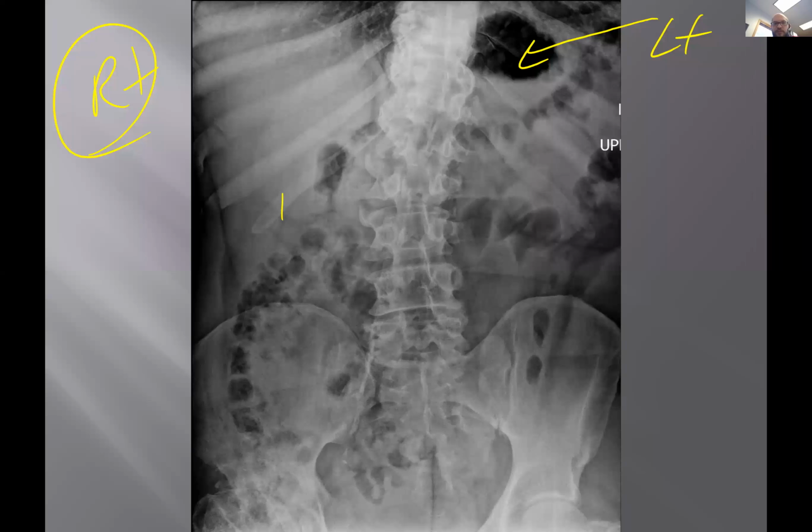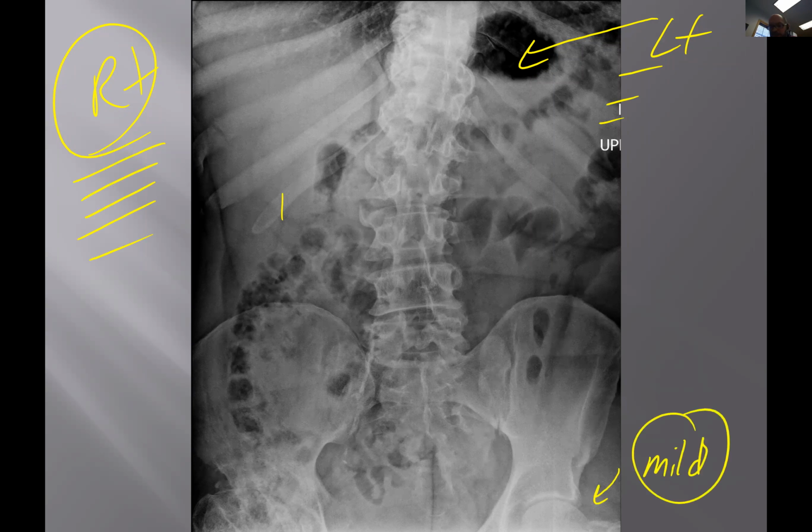You're right. Well, I do agree that it's a little narrow, mild on that left hip, but look at the other hip. I meant right hip. Yeah, oh, good. Isn't that nasty, guys?